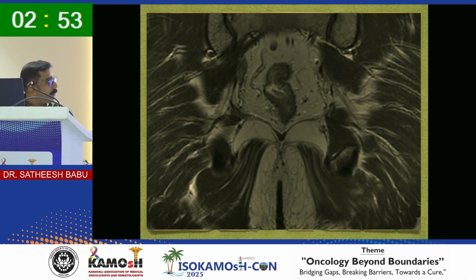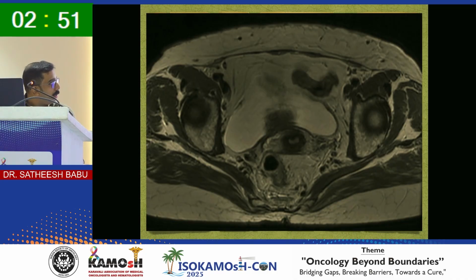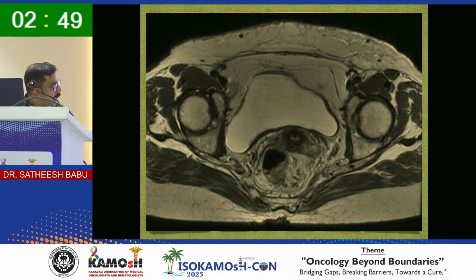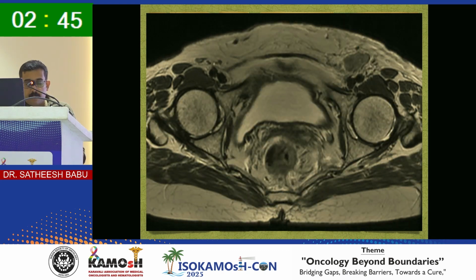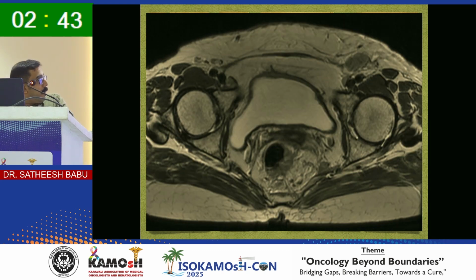So this is a tumor which we have seen previously. So this is another case. You can see tumor, and you can see the infiltration into the perirectal fat. You can see the gray thing. So it's not a white line; it's a thick gray line. And you can look at the relation with the mesorectal fascia, and it's very close to that.